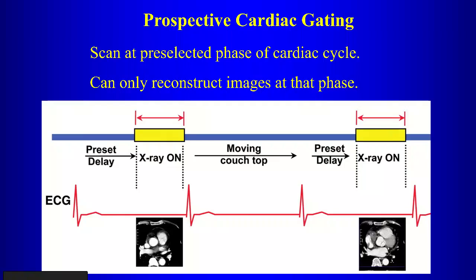When we're doing coronary calcium scoring, what's the slice thickness of the images you're looking at? 2.5. What? 2.5. Yes, it's 2.5. Why? Why is it 2.5? It's always 2.5. Why? I mean, we can get 1.25, we can get 0.5, 0.625, right? You can do whatever you want. Why is it always 2.5?